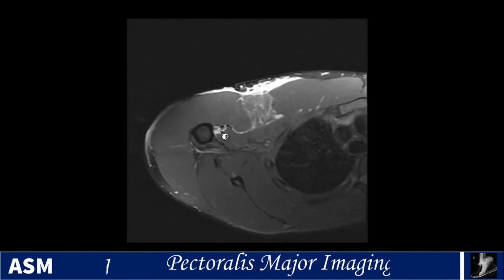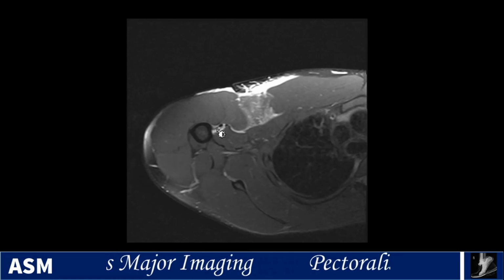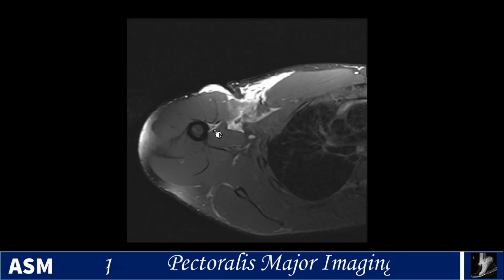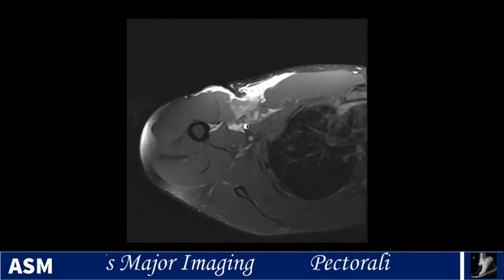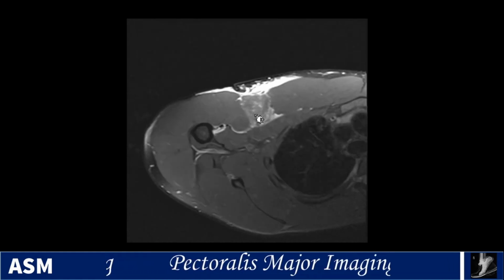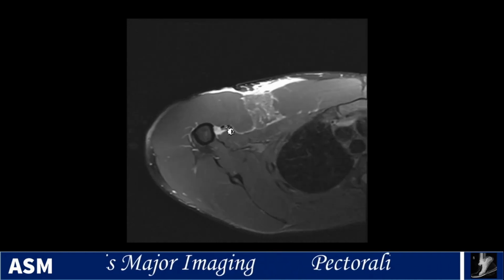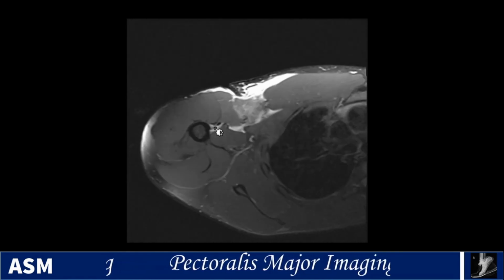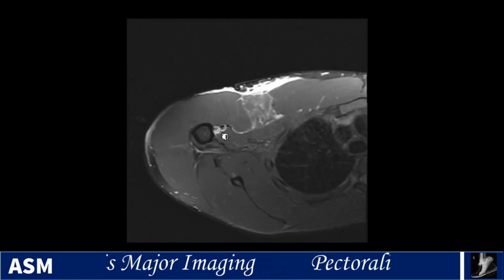And here's another case here. Again, the fluid around the biceps, it's elevated away from the humerus. You may see a little bit of the stump of tendon coming down here, but there's no tendon continuity coming all the way back like we saw in the earlier cases. And instead you see this redundant tendon back here, retracted back with a lot of muscle edema and maybe a little hematoma down here. So this is another tear. In this case, if you want to call it a tear from the humerus or the tendon just proximal to the humerus, but it's a complete tear.